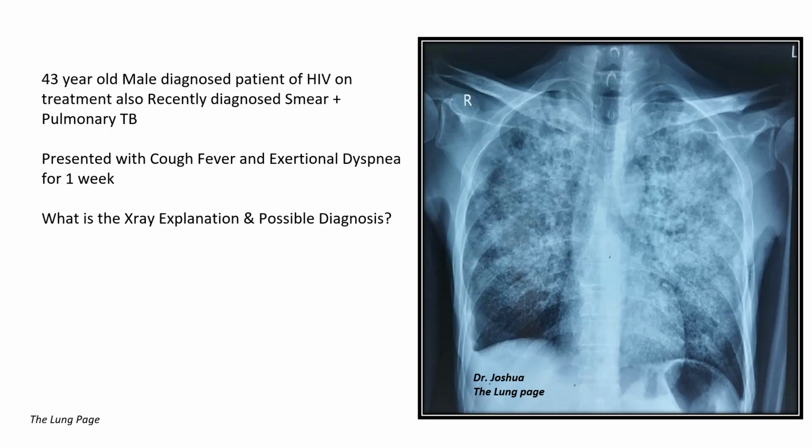Okay, as we all know, this is the chest X-ray. Airway is normal. Bones, everything is normal. Cardiac contour is normal. There is no effusion. The diaphragm is normal. And when you see the lung field, there are patchy opacities involving mainly the perihilar area, from central to periphery. Patchy opacity mainly involves the upper lobe and middle lobe. The lower lobe is also a little bit involved, but mainly the upper and middle lobe.